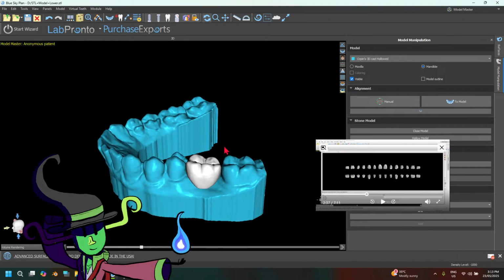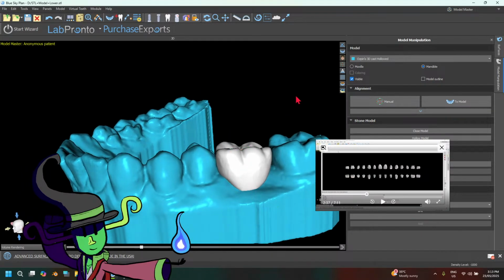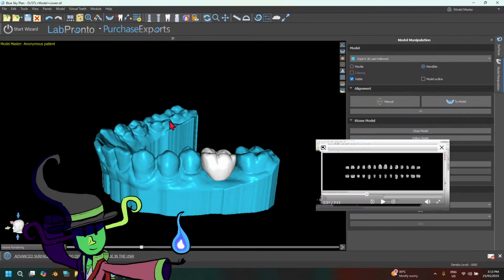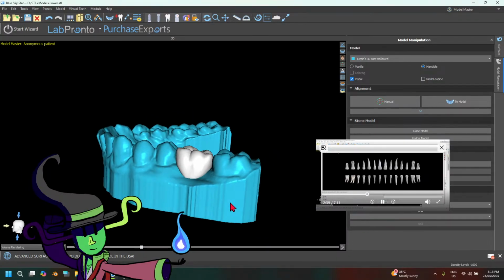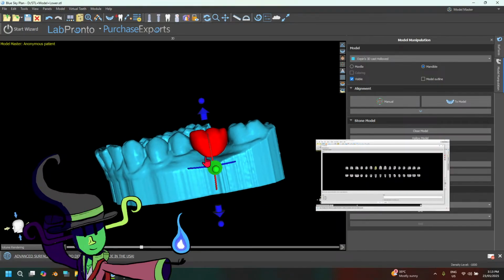Too nicely, in fact. I guess the one thing we can maybe edit is to lift up the gums here. But I think I can do that even in Blender if I wanted to. Maybe we can just move it a little bit higher. Can we get much higher?